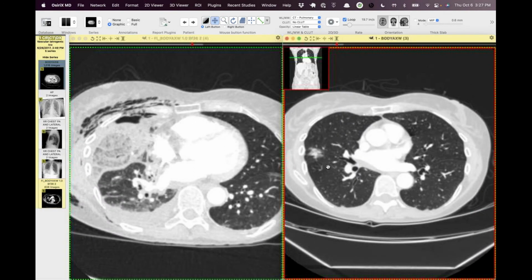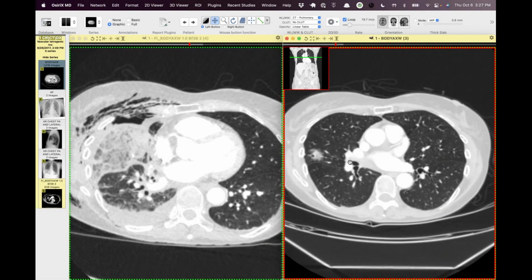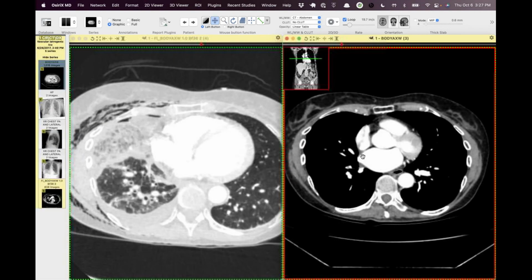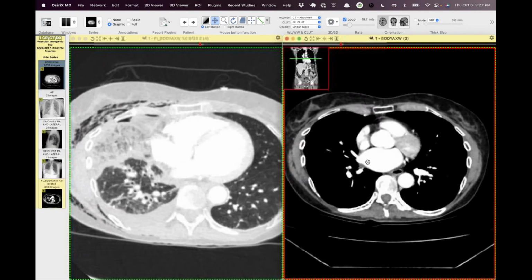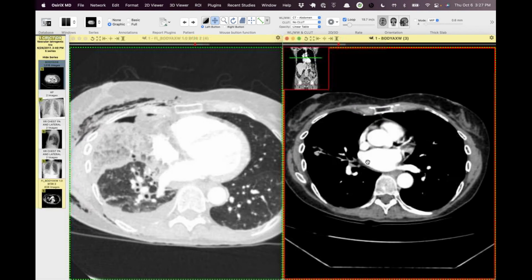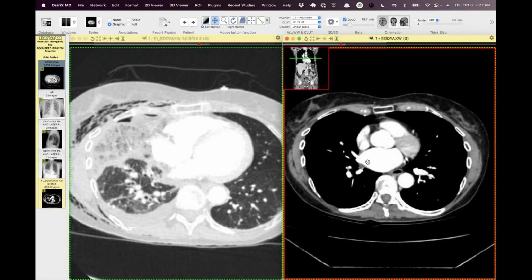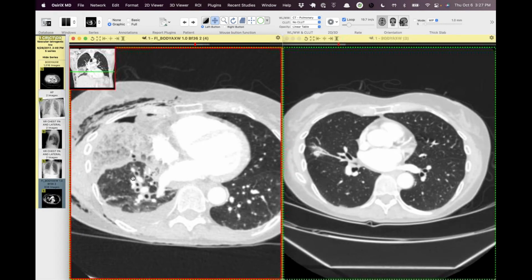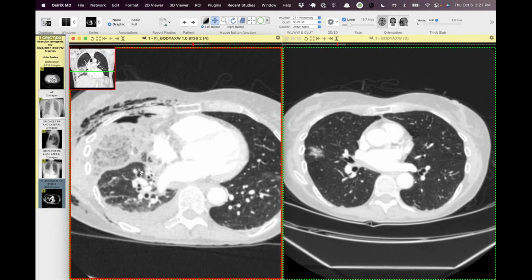So it looks like what a torsed lung or a venous thrombus, or any other infarct, would look like. It's just very boggy and expanded. So they went in and took out the rest of it. She was fine, but it was curious because her anatomy on the pre-op wasn't some crazy variant.